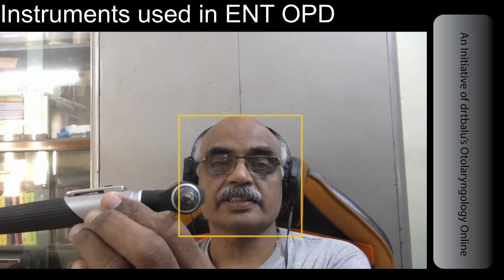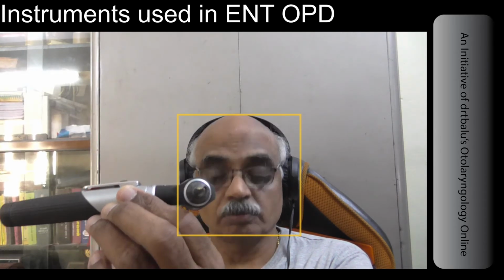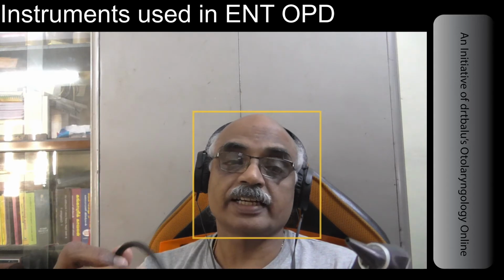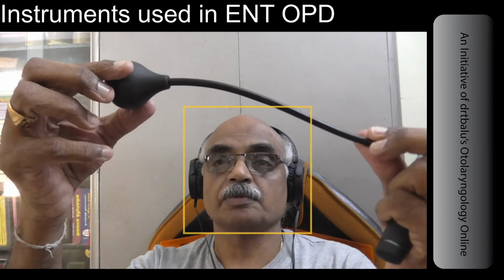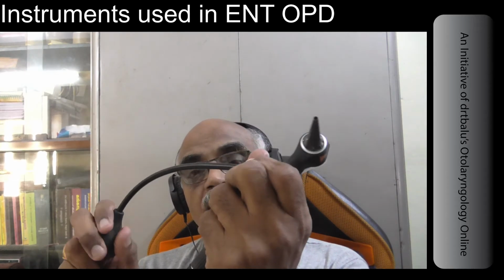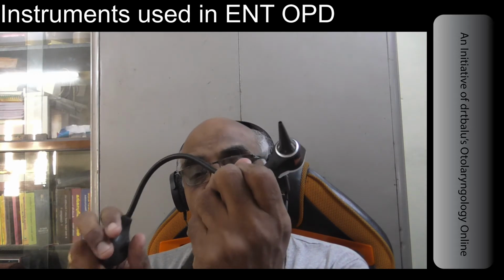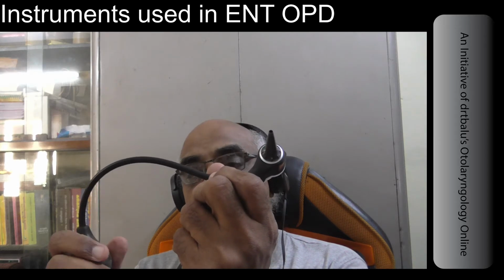The speculum plays a very important role. It straightens the external auditory canal, thereby bringing the entire eardrum into vision. Then you can attach a Siegelization bulb to this otoscope, and you just compress the bulb. This serves the same function as a Siegel's pneumatic speculum. You can test for the mobility of the eardrum using the otoscope by attaching the Siegelization attachment to it.